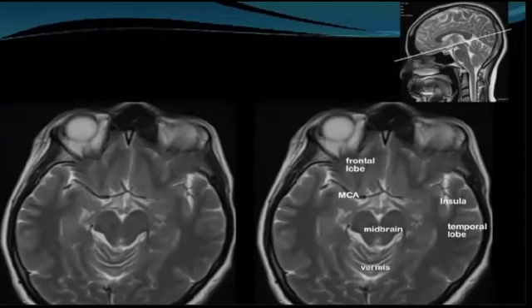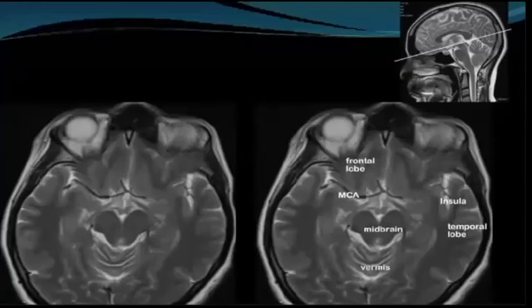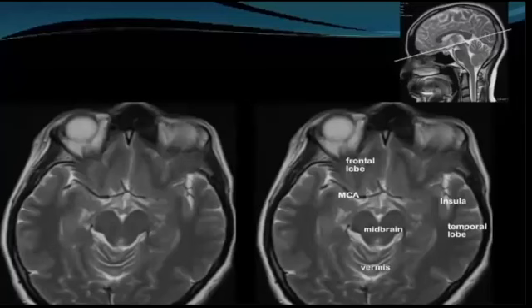That's first. Now I'm going to move back to the slide, which has the 3. Now, please take a very good look at this image, because now I'm going to move from this image to this. Now, this is the T2. Okay, this is the T2. Look at the T2. Look at this. Okay, now again, look at the flare. Can you see the flare from here? Now, after you look at the flare, please, again, look at this.